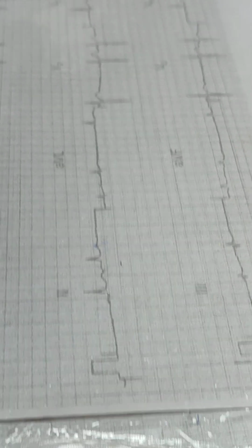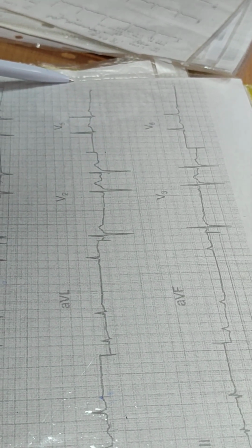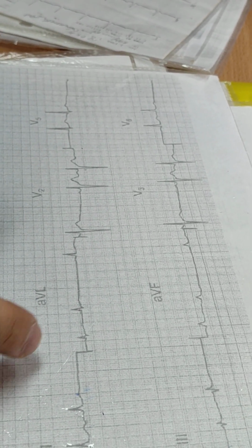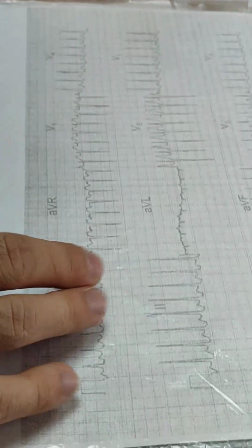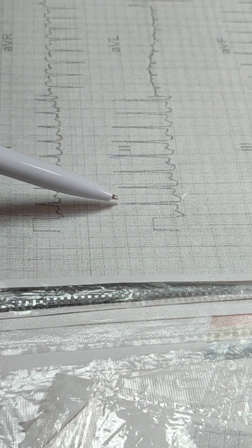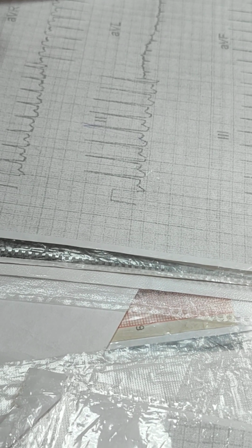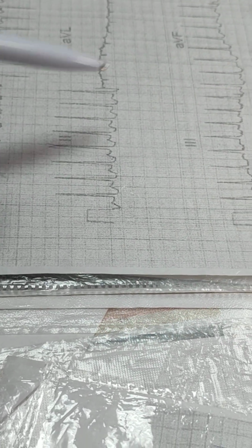This one is not very good. It looks like an extrasystole. Very short distance, but there is a pause after this. No P waves, but it's not a very good card because there are no next complexes. Very short distance. Tachycardia. Let's check this lead. It is T. So P wave is absent. Non-sinus supraventricular.